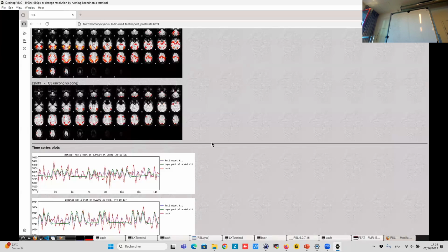That is a way of showing how your data are fitting. In red you have your data, and in purple how your data is fitting, how you fit your model to the data. So if it is perfect, we'll have a complete overlap between these two lines.